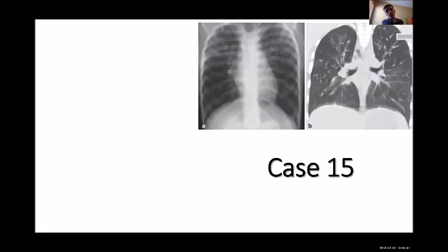There is increased intercostal space, non-homogeneous, but they are not symmetrical. If you look on the left, some of the ribs are crowded, and here it's open. So there is increase, especially in the lower area. It's more lowerly affected than upper. Upper, it looks like good space. The lower becomes very displaced, and is not symmetrical on both sides. So the inflation is really on the lower side. What else?